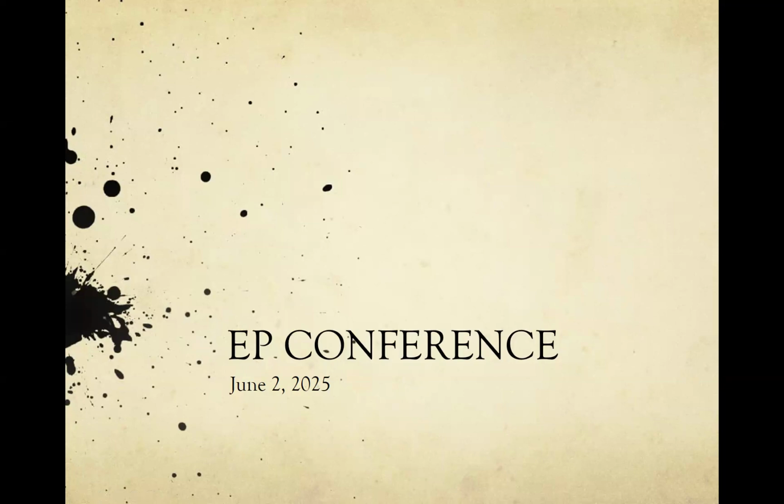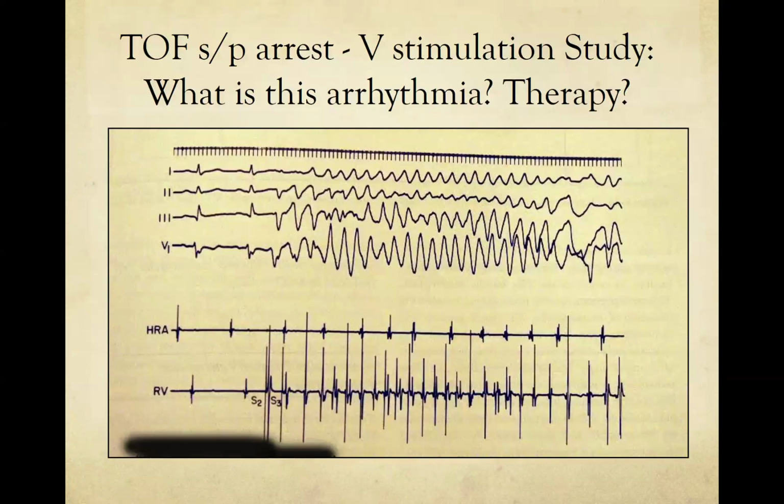And let's go forward. Okay, so this is a V-stim study. This is a tetralogy of Fallot patient who had an arrest and underwent a V-stim study. So the question is, what was induced here and how would you manage this? So why don't we ask Maya, what do you think we got going on here?